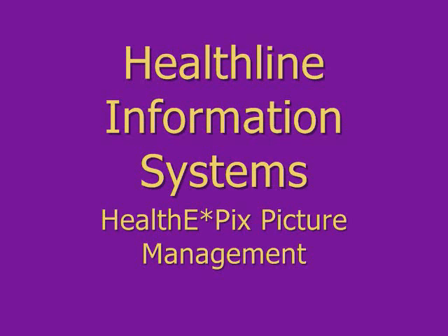Like all of our applications, HealthEPix is highly configurable. The screens you see can all be tailored to show and capture only the data you want. In addition, HealthEPix has a built-in forms tool that you can use to document the pictures that you have taken. The forms, like the application screens, are customized to your site.